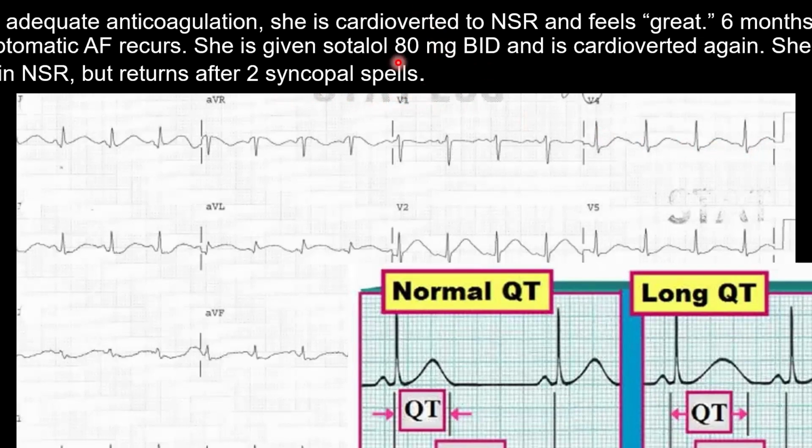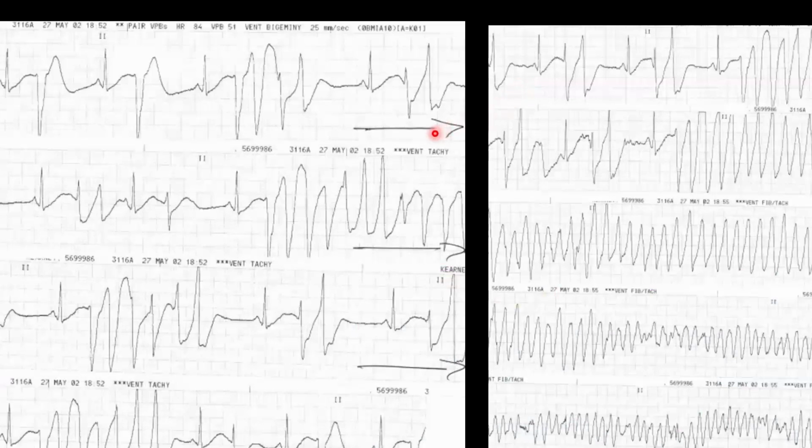VTAC. Well, yes, that's true, but what kind of VTAC? And the answer is torsade de pointes, torsion of the points, or polymorphic VT.